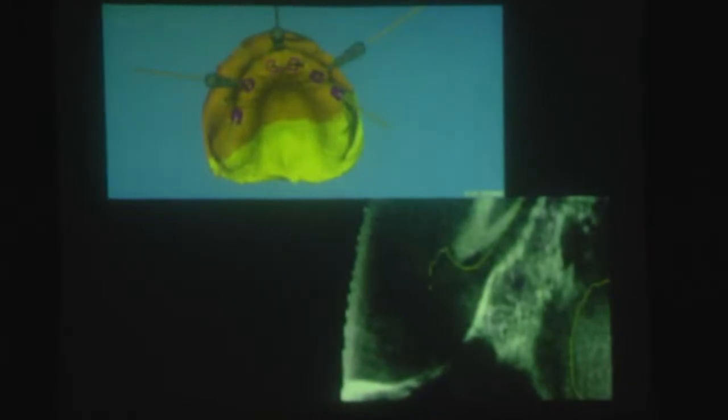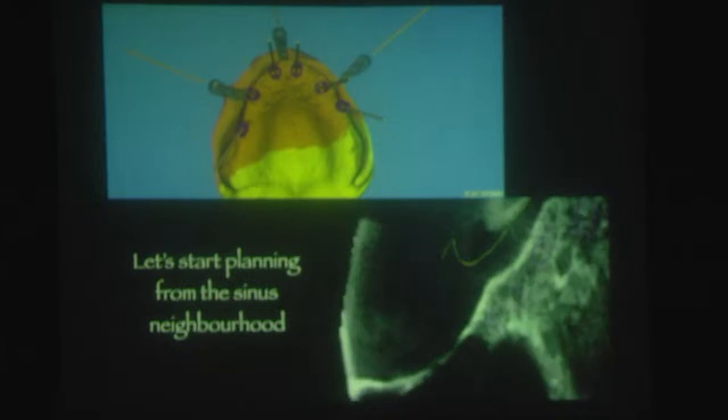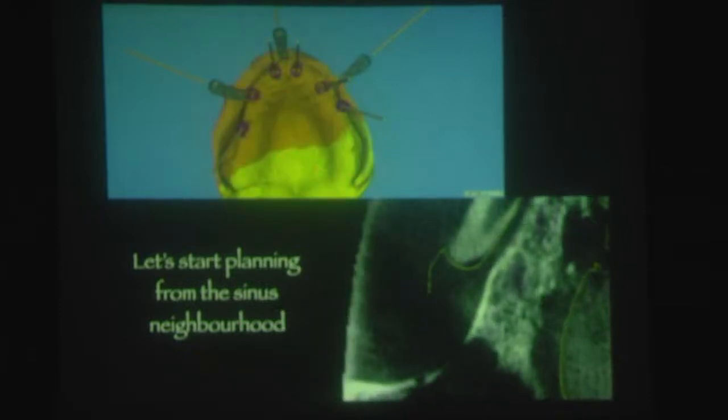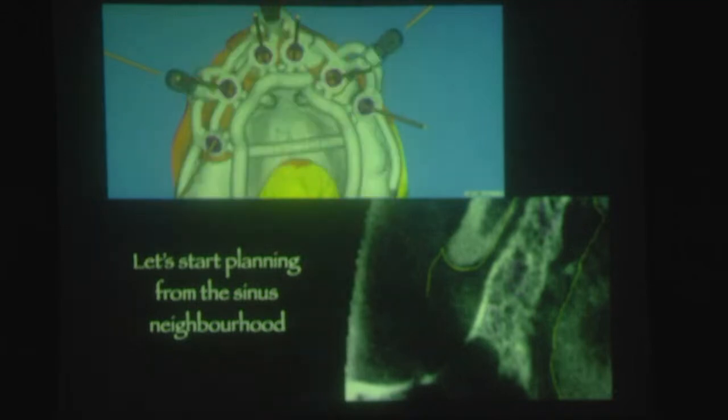So we put every data on MSoft, and we try to play with the game. For example, we place an implant, then we didn't like it, we changed the position, we changed the angulation, we changed the depth, we changed the diameter, we changed the length, we changed everything.